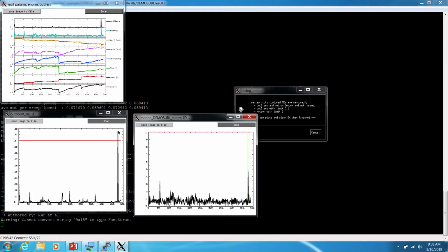It's a little hard to see, but there's a green line here. It'll be apparent in the other one. This gives you an idea of how generous our cutoff is, because there's a lot of activation down here, and it's clear that this is not really part of the signal, because look how huge it is. We would expect things around 0.01, 0.02 down here, not a big spike. So we're pretty sure this isn't real data.